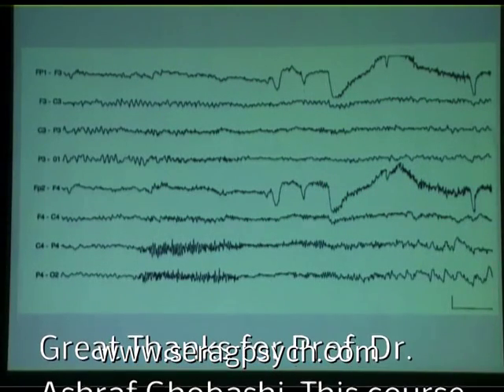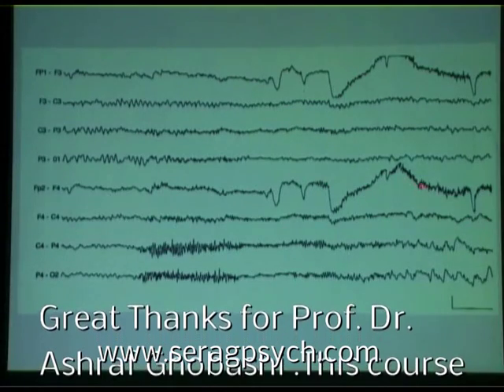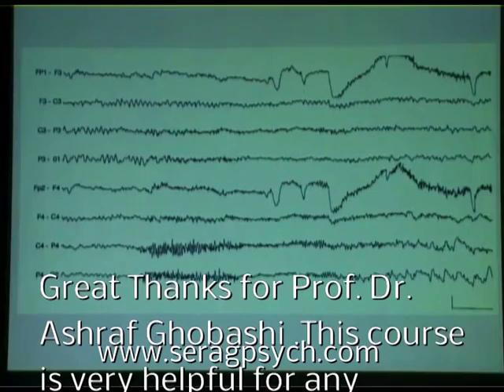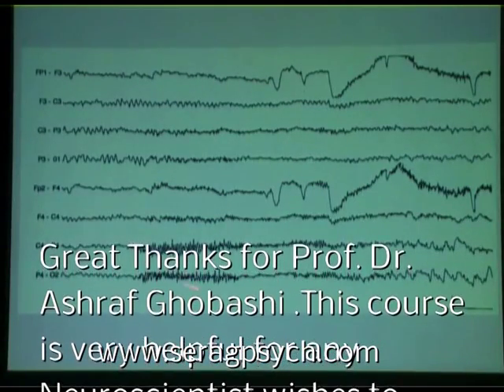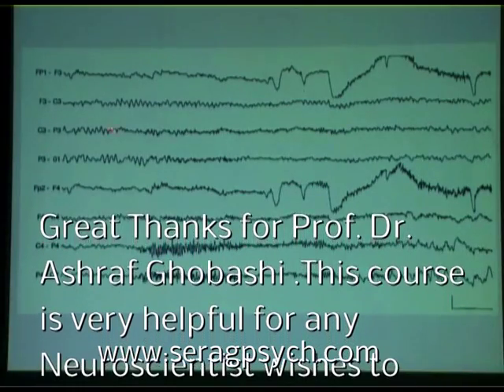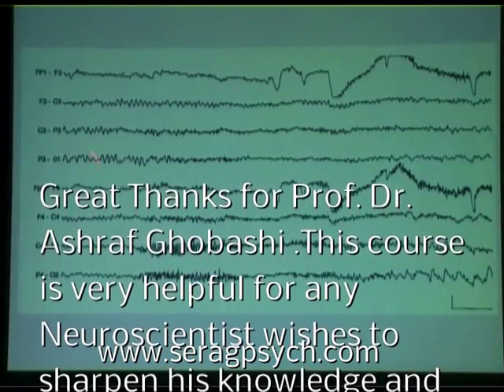But this is an interesting EEG nonetheless. This is muscle activity here. And this is muscle activity here from frowning. From frowning. Okay, but that isn't a seizure. Totally different. So here's the background activity here. This is the left posterior head, and this is the right posterior head. There's a little bit of a distinction between the left and the right.